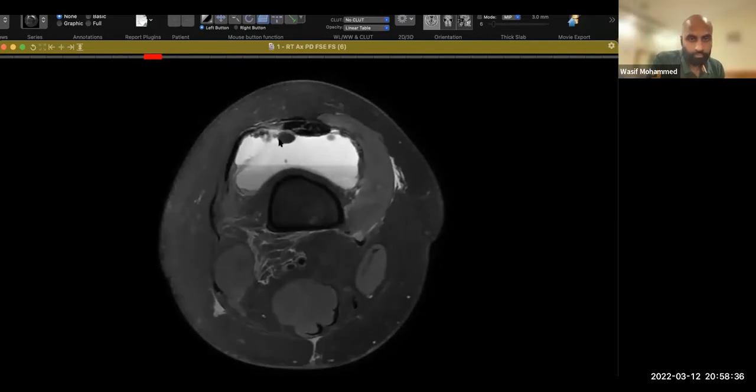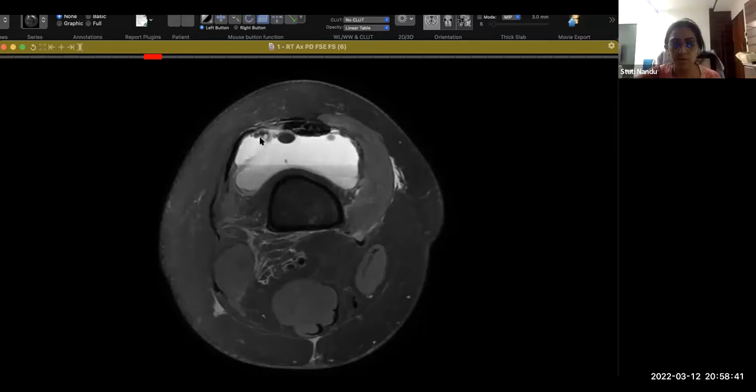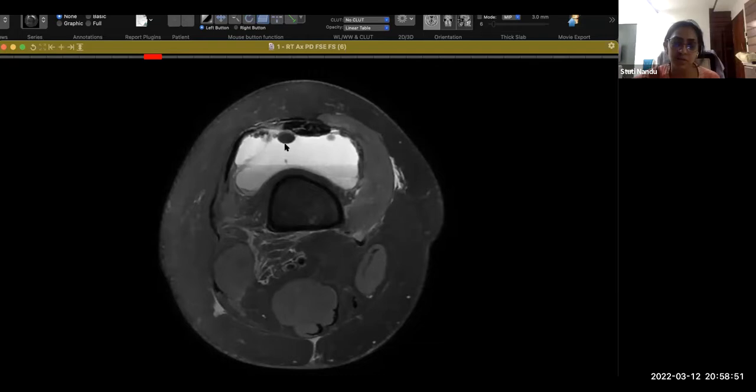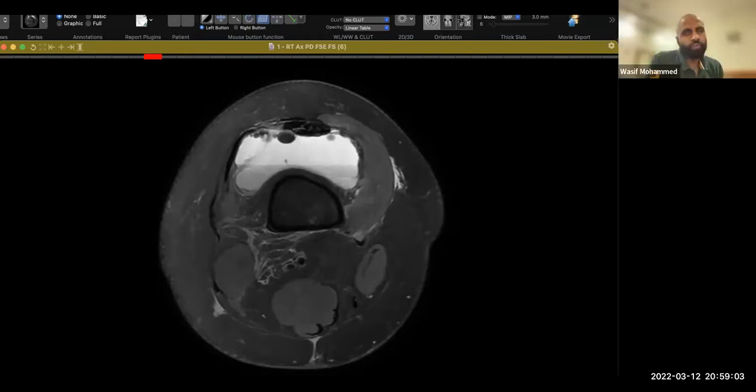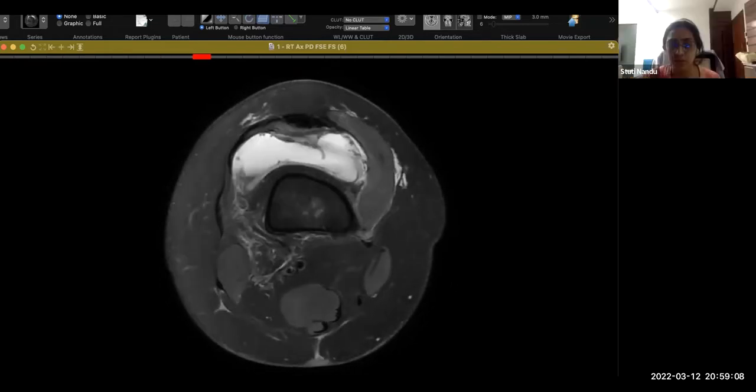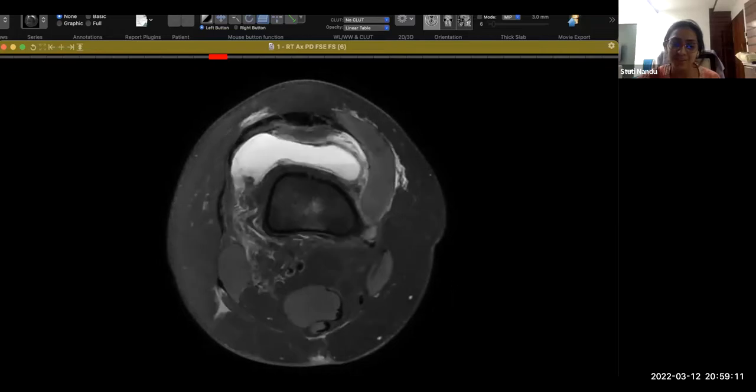These ones here. So these could represent some loose bodies, or they could also be a case of synovial osteochondromatosis with osteoid matrix. So you expect loose bodies to float on the effusion in that manner? No, they would not be floating there.